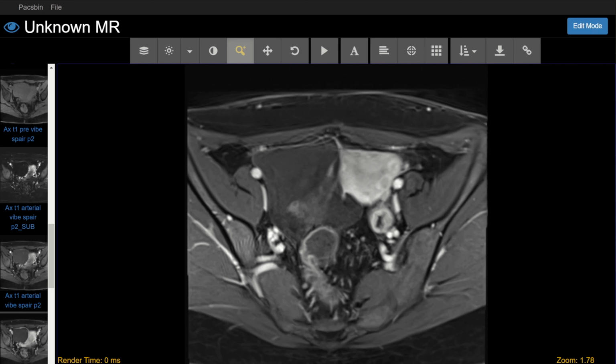Let's move on to some key principles that you need to know before looking at pathology on pelvic MRI. Some of this was covered in the body MRI video, but we'll focus on the most important stuff for pelvic MRI. All of this will be reinforced in the MRI cases as part of this course. Of course, simple fluid like the urine here in the bladder is going to be very hyperintense on T2 weighted imaging and hypointense on T1 weighted imaging.